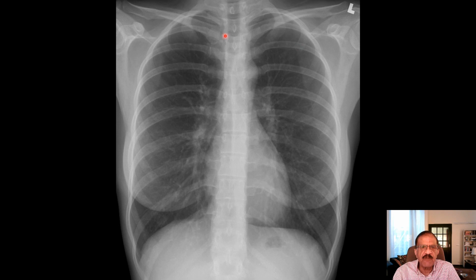This X-ray chest is more clear. This is the first rib, you can see this is the first rib, and from this point, this is the second rib. From this point upward, there is the upper zone. This is the third rib, and fourth, and fifth, and sixth, and seventh, like this. I don't see any problem with the chest cage. It is normal. There is no problem in the costophrenic angles. It is clear. No fluid accumulation. Absolutely normal contour.